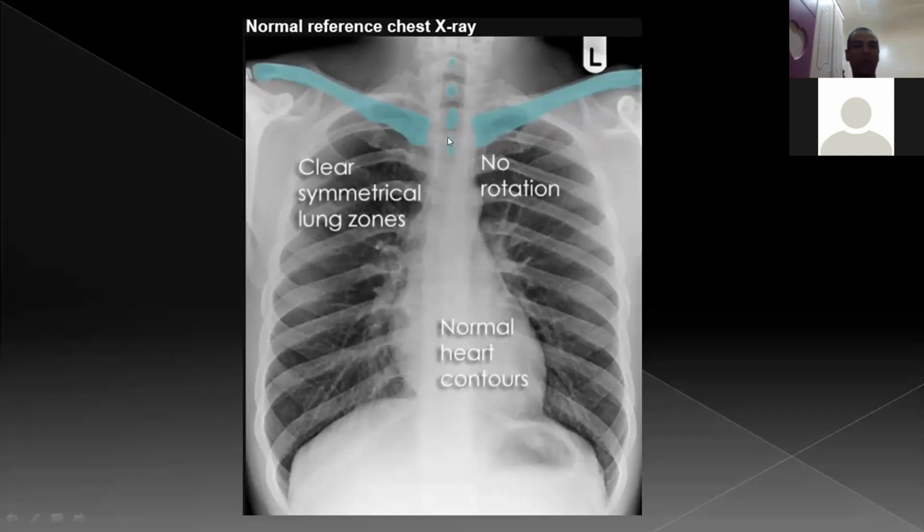and all of this. And again, you should have a clear outline. What does it mean, clear outline? We don't have any paratracheal masses, no paratracheal shadows, no mediastinal shadows. We have also clear costophrenic angle. This one is called cardiophrenic angle, as we will say later on, and this one is costophrenic angle. We also have this gastric bubble, and between the gastric bubble and left diaphragmatic copula, it's not exceeding more than 1 centimeter. And we don't have here any gas lucency on the right side.